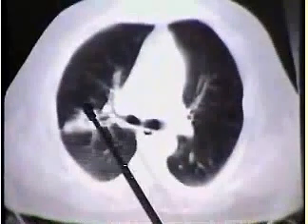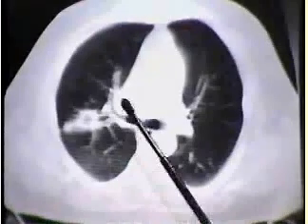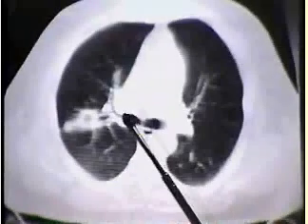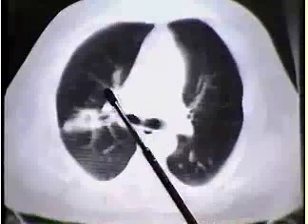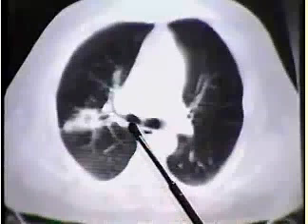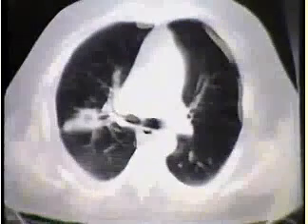This is the lung window on this same patient, showing you where the lesion is. I wanted to point out how much better these windows are for demonstrating the contours of the bronchi, for appreciating that there's more tissue surrounding these bronchi than there should be because of the lymph node enlargements. Particularly, notice the thickening of the wall of the bronchus back here. Now, this is the right main stem bronchus, and this is the takeoff of the upper lobe, and we're going into the bronchus intermedius, and there should be aerated lung behind this bronchus. Instead, there is a soft tissue mass, which represents the lymph node.